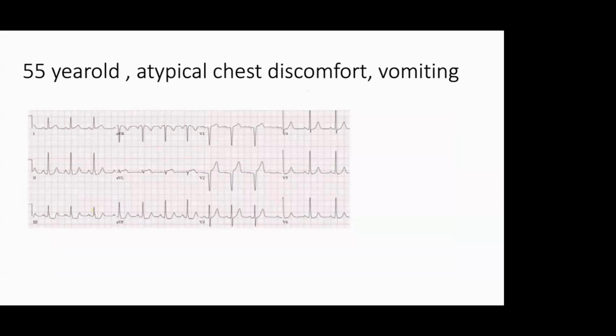Is it MI or is it something else? This is not any high risk problem because the ECG looks not very alarming, but there are subtle changes, so that if you do a troponin, it will be positive. Can anyone tell the diagnosis? Just seeing the findings is also enough. No, you don't have to localize it.